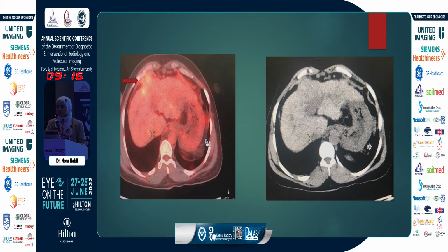Another case of liver cirrhosis with hepatic focal lesion, HCC. Here is a hepatic focal lesion seen bulging outside the liver contour. This lesion shows moderately increased FDG activity, which proved to be a moderately differentiated HCC.